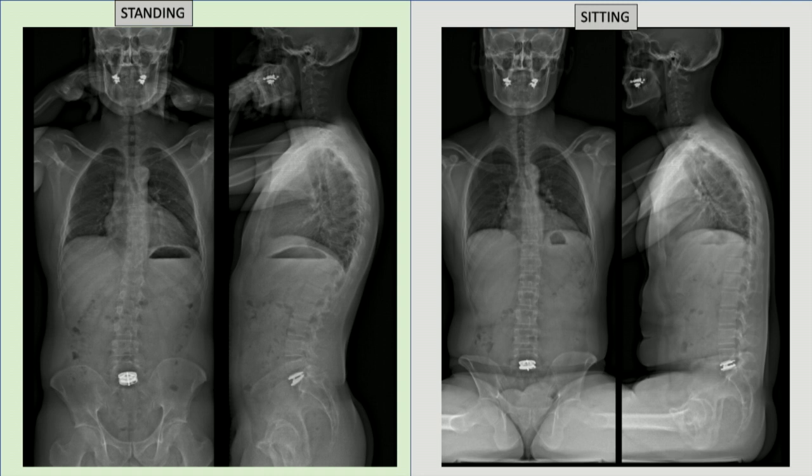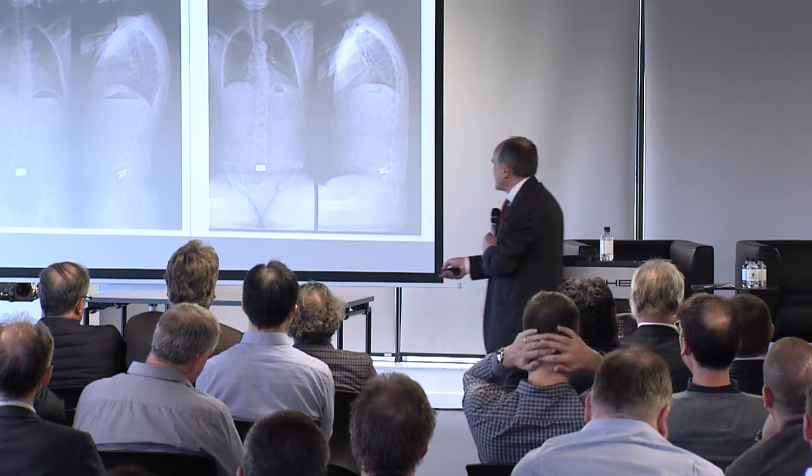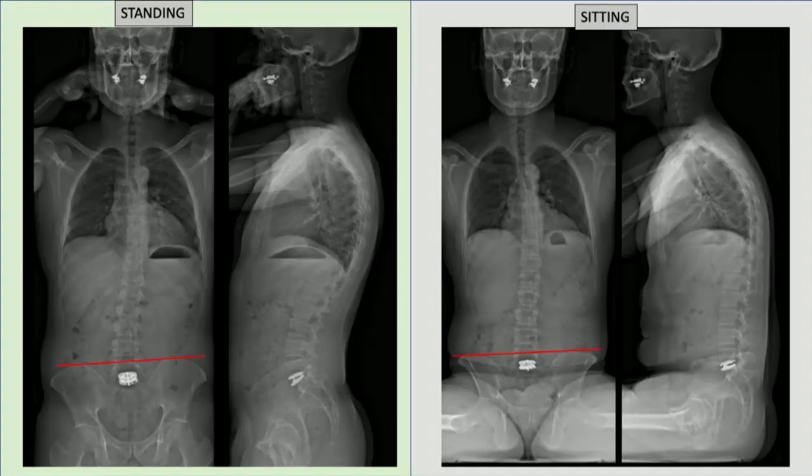As you probably understood, we use standing and sitting X-ray. You have the standing X-ray, and you have the anterior opening of the prosthesis standing, closing the prosthesis anteriorly in sitting position. And something was very surprising for us. It is this problem of alignment of the pelvis. So you see in the sitting position, the pelvis is more or less horizontal, and in standing position, this patient has a pelvic obliquity, which means that probably this patient has some leg length discrepancy.